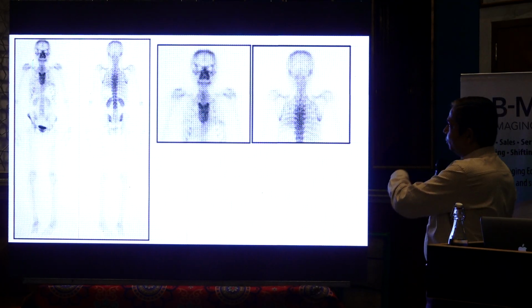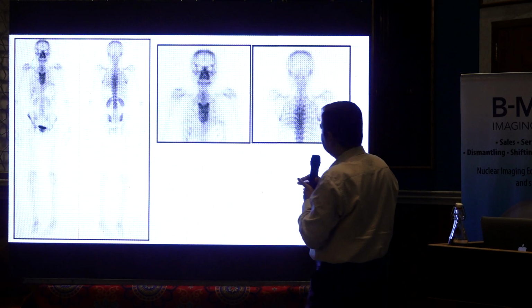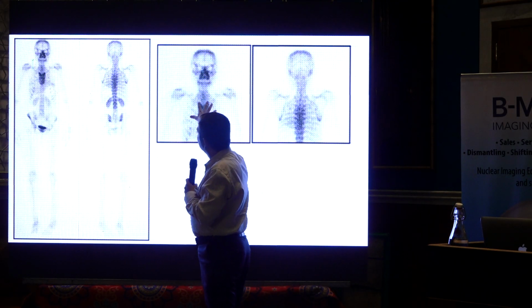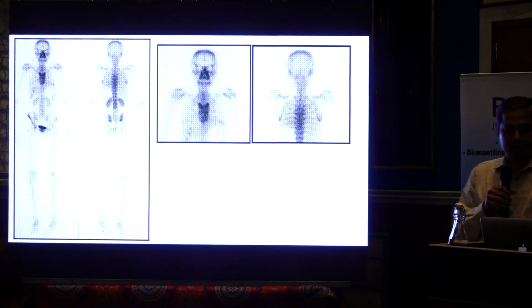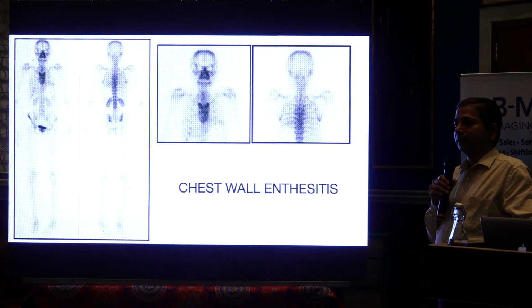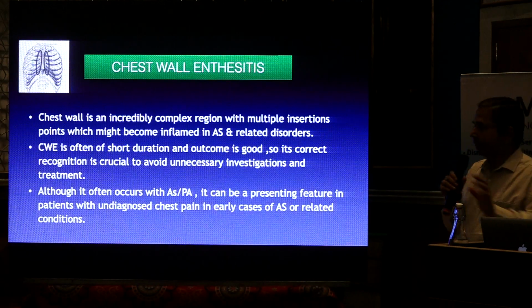Then she was sent for a bone scan. You see, there is increased uptake in the sternum. So this is a case of chest wall enthesitis. What is chest wall enthesitis?